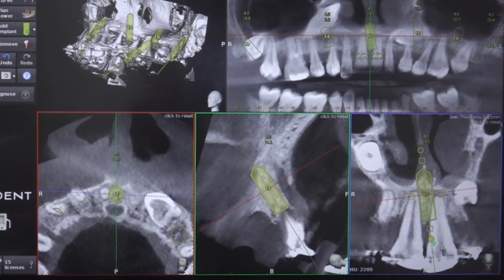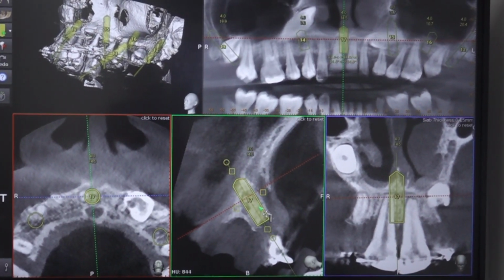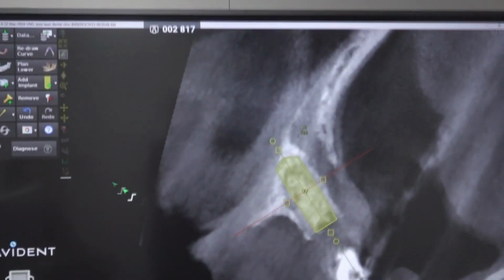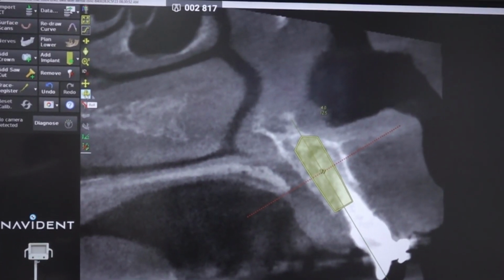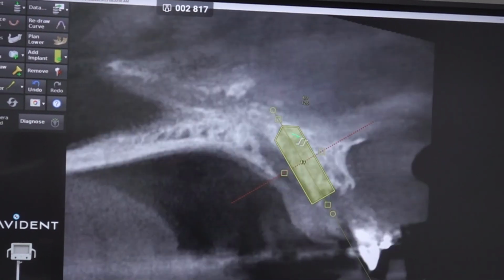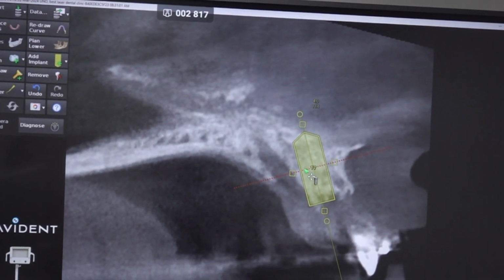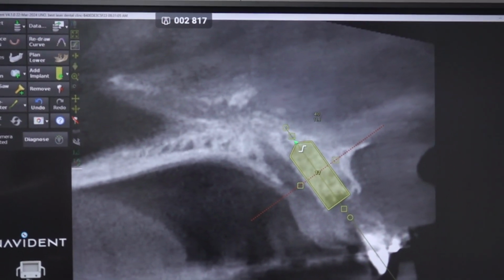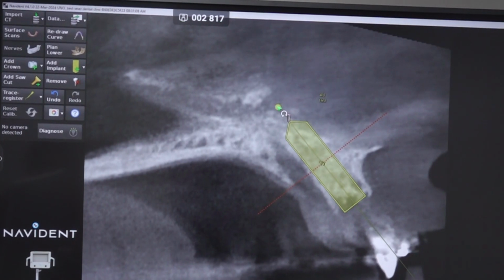Okay, placing one implant in the midline. Of course, it will be a very short implant. Okay, either axially or parallel approach, like this. So, if you avoid palatal approach, you can get some stability from the vomer bone.